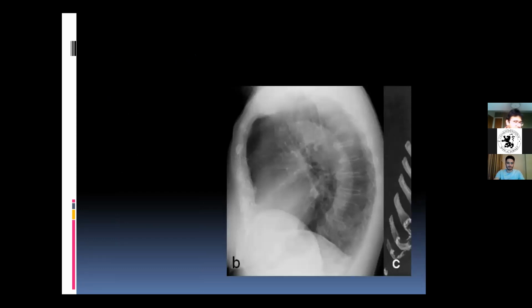So this should be a very obvious kind of X-ray to you. Good. There's hyperkyphosis. Well done. What else? What's really weird about this X-ray, or pathognomonic, I'd say, of a specific kind of condition?